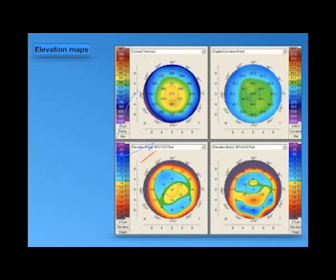So the astigmatic cornea may show abnormal elevation maps on the best fit sphere. So it's calculated by the module called ellipsoid map. In cases of hyperopia, there are higher posterior elevation points or figures than present in the spherical and in the myopic, because of the nature of the cornea, especially if the hyperopia is related to the cornea, not to the axial length of the eye.